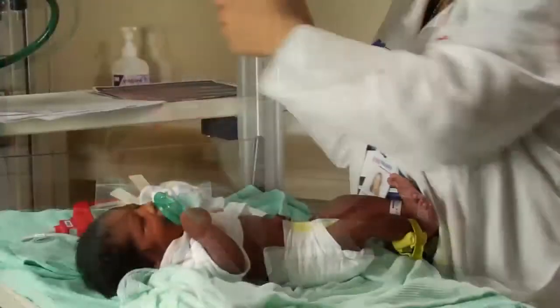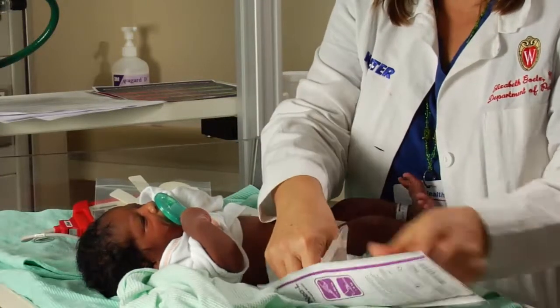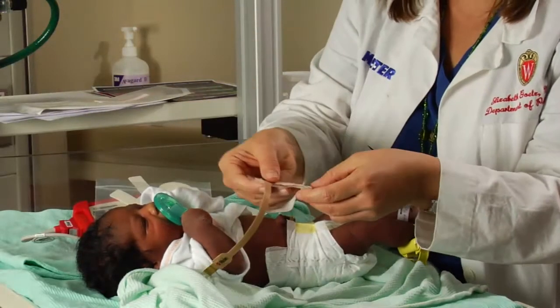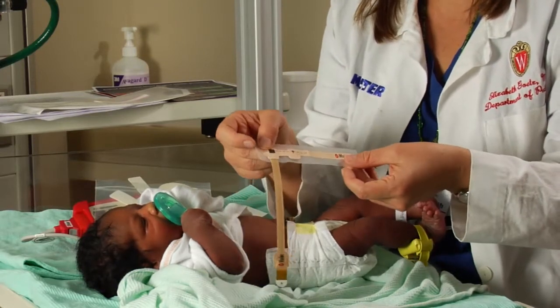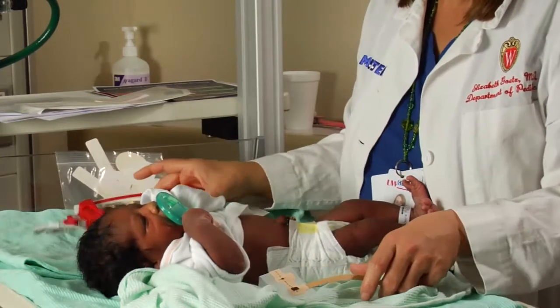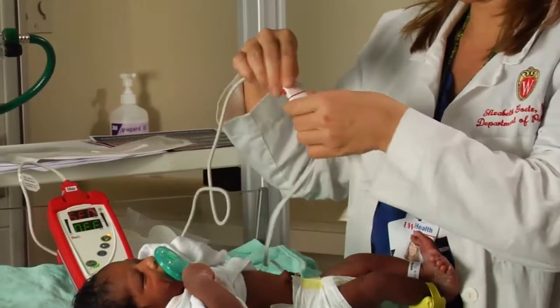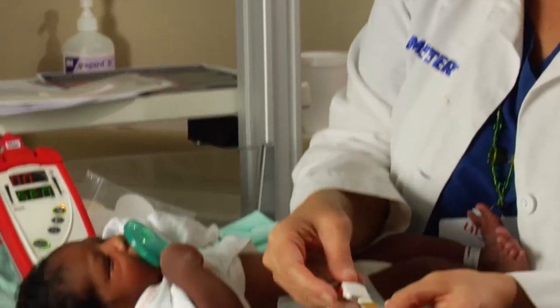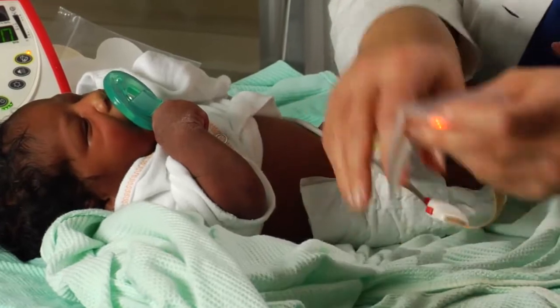be using. In our nursery, and in many nurseries in hospitals, we do use a disposable probe. This disposable probe looks like this and comes with a little sticky backing. We found in our nursery that the probe with the longer tail is easiest to use. With the probe, all you would do to use the disposable probe is disconnect whatever other probe is on there and insert the sticker with the yellow bars up on the connecting piece.